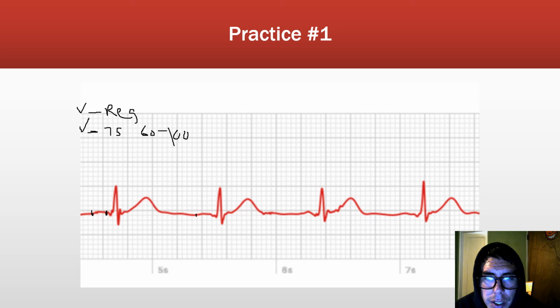Got one right there. Got one right there. And we've got one right there. So these ones actually look a little bit different.